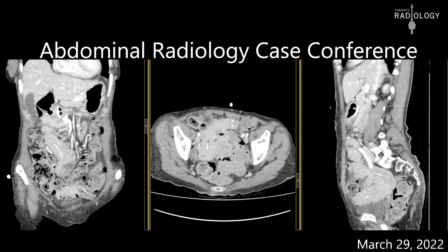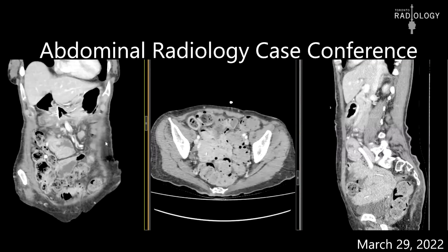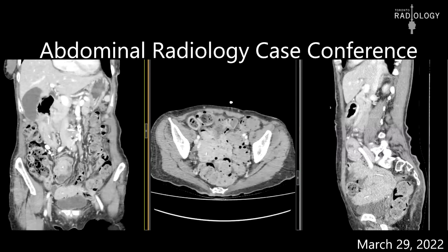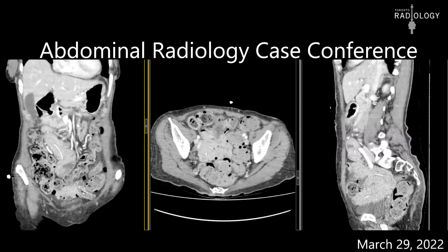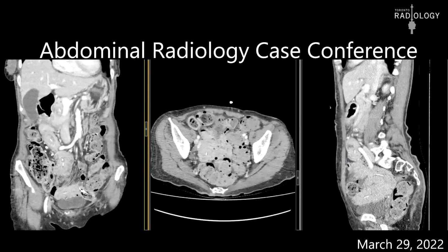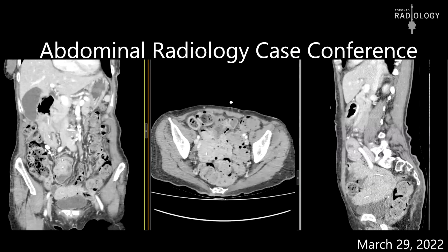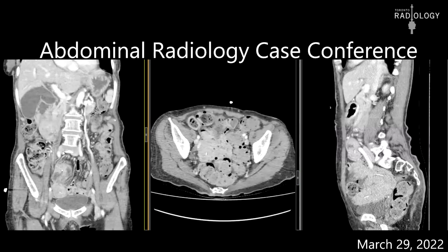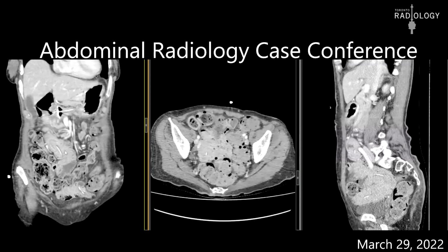What is that linear structure? Is it a tube? Exactly. But the bowel is all thick around it and scrunched up. Is it intussuscepted? Yeah, exactly. Around the J component or something? Yes. So essentially, that was all the questions I had.